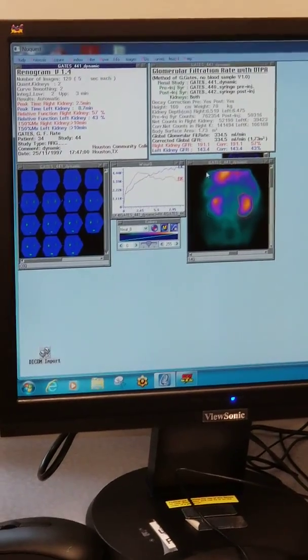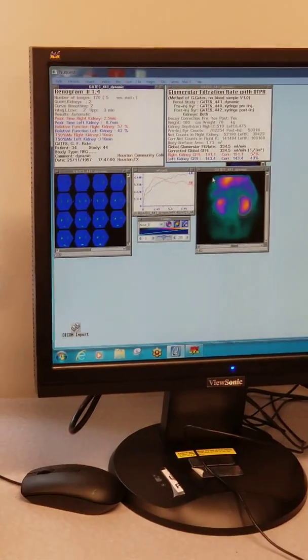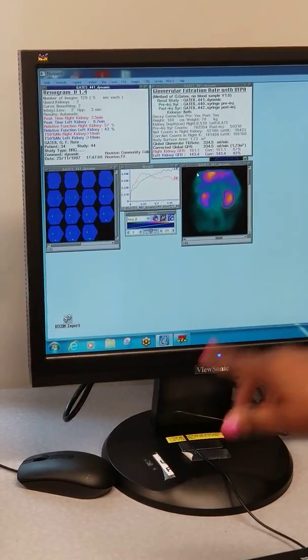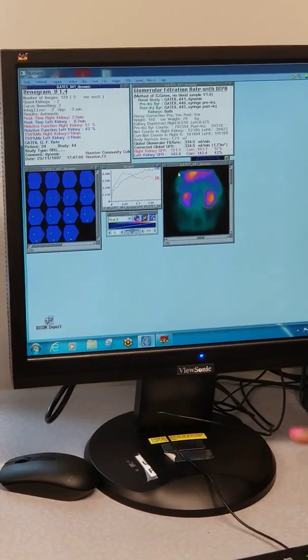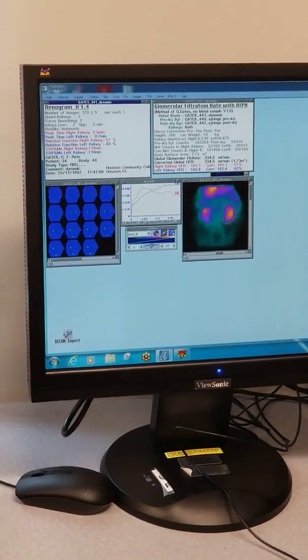So every single picture? What do you mean? No, just what we showed you. Okay. So unlike the MUGA, you don't have to go through each. But here, you just draw your one region of interest around your right, your left, and then it's easier for me to draw on the board real quick. The banana.